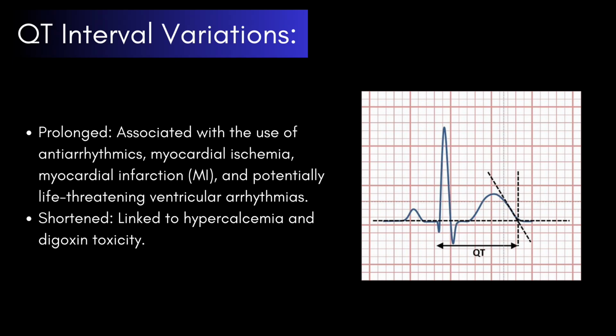Next, let's look at some variations of the QT interval on an ECG. Prolonged QT interval is associated with the use of antiarrhythmics, myocardial ischemia, myocardial infarction, MI, and potentially life-threatening ventricular arrhythmias. Shortened QT interval is linked to hypercalcemia and digoxin toxicity.